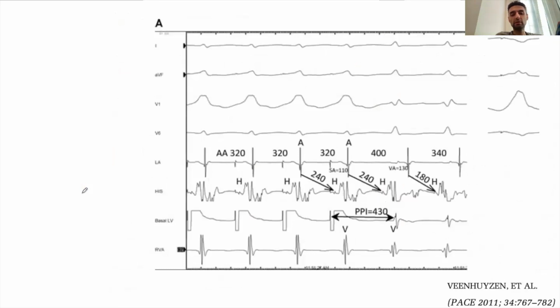Okay, here's another example of pacing. This time it is burst pacing, slightly faster than during tachycardia. But in this case, you are pacing from the LV. Okay, so there are your surface ECGs. There's your LA catheter, His, and RV catheter. So you're pacing at 320 milliseconds.